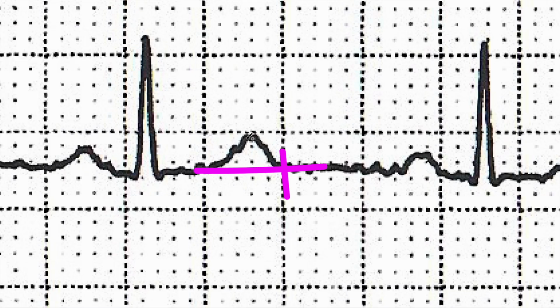So as you see this T wave coming down, you find the sharpest point here. What I mean by that is, when you look at the slope, I need to change colors here. Let's do this.